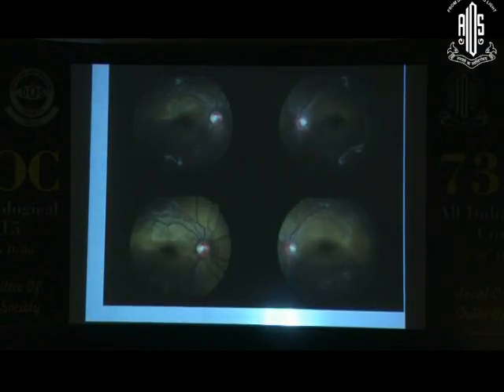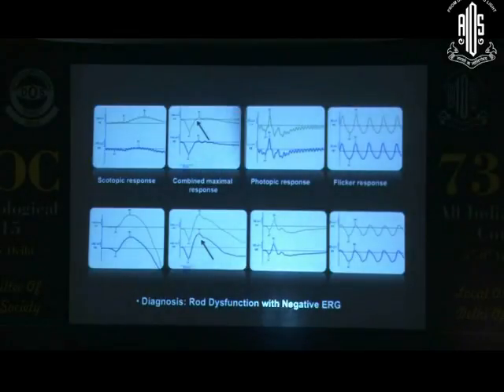This is, I think, a 6-year-old child. Okay, so we've spoken about a 6-year-old child with difficulties in dark vision. I think the fundus pictures are quite characteristic. You see the classical Mizuho Nakamura phenomenon. So that's before and after dark adaptation, and you see the ERG.